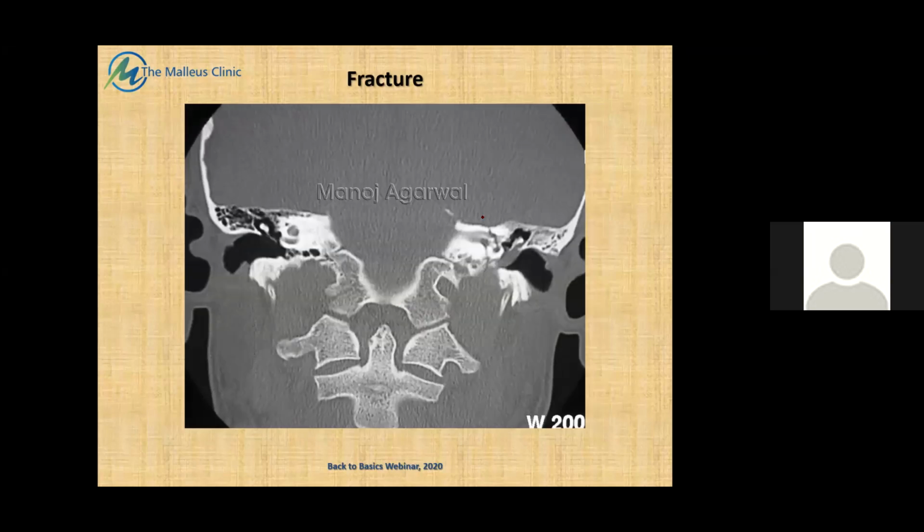Same patient, slightly different view. You can very well see the fracture line here and the fracture line here. And so again, along with the hemotympanum in the left tympanic cavity.